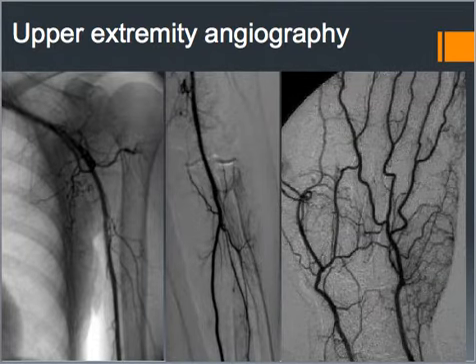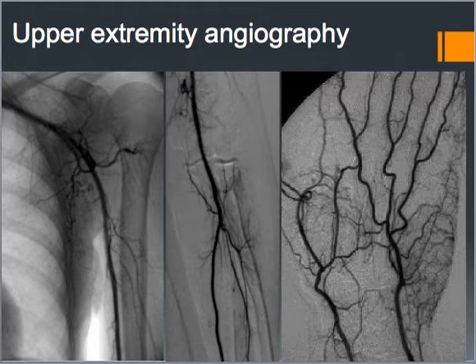These are just upper extremity angiography. So here you've got your shoulder and arm. You can see all the blood vessels. This one you can see the anatomy behind it. This one it's hard to depict what it is, but it's actually a wrist. I can see the radius and ulna here, but they've subtracted it. They've used that digital subtraction to kind of remove the bone so you can just see the blood vessels. And then this is a hand. So thumb, fingers, and then the palm here back down to the wrist.